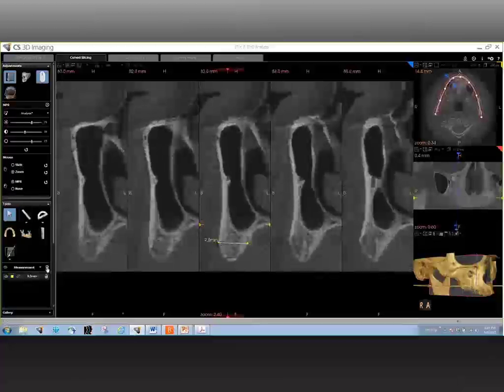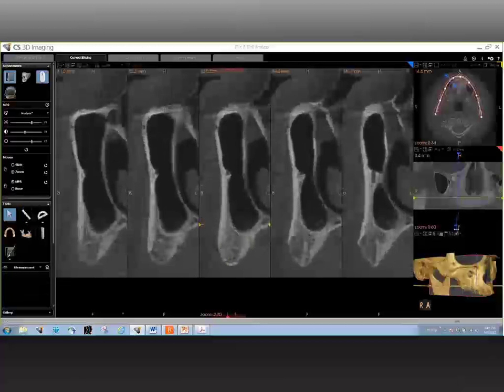And now you see there's even better gain. Even the quality of bone has increased in there. You see more trabeculation of the bone. You see the cortical bone seems to be a little bit more intact, and those kind of things.